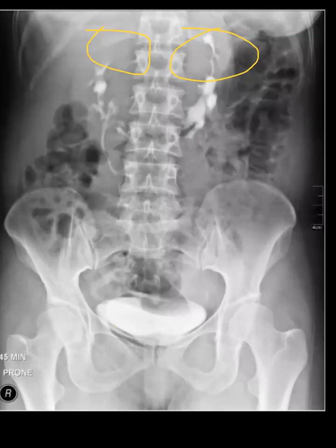Whenever the lower poles are coming medially, actually these are some type of horseshoe kidney. Both kidneys are lower than expected in a young patient. The lower pole points medially, with fusion across the midline. So there is abnormal orientation of the renal pelvis and calyces, but the ureter then takes the normal course in these patients. Always remember that in horseshoe kidney the lower poles are fused, especially in the medial area.